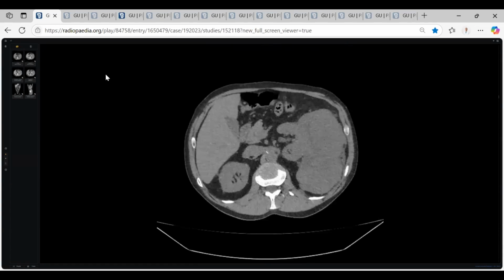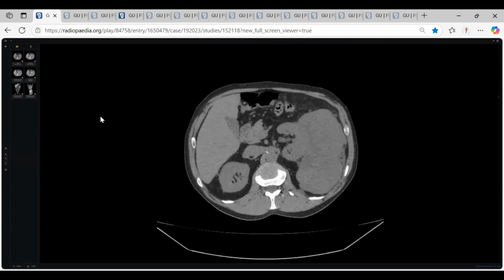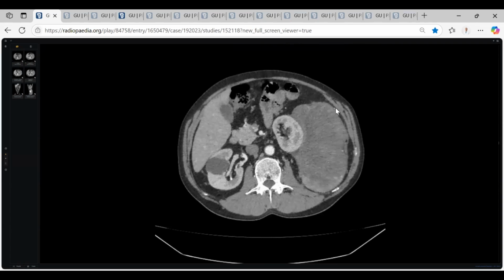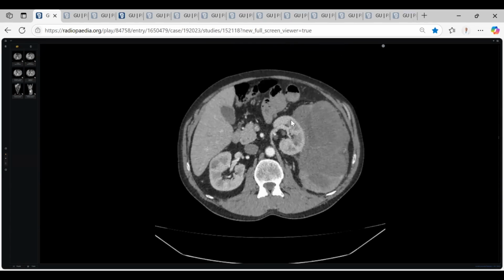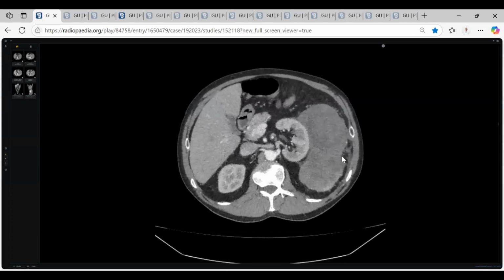You are amazing. See my colleagues, large retroperitoneal left perirenal mass lesion. Why is this not renal? Look at the maximum size. Most of the size of the tumor is centered within the perirenal fat, just surrounding or partially surrounding, abutting and displacing the left kidney. Second point, there is no claw sign of renal tissue. If this were of renal origin, you must see renal tissue stretched like a claw sign surrounding this tumor.